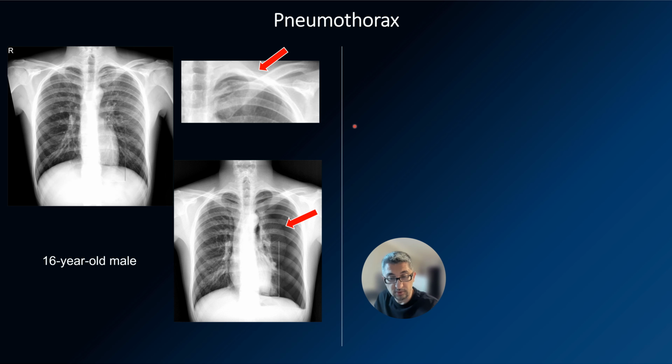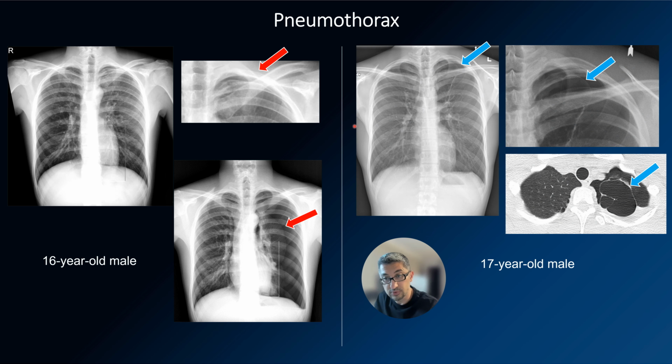So when there is pneumothorax, we should also pay attention to the underlying cause. For example, in this patient on the X-ray, we see a tiny pneumothorax, but there are also these well-circumscribed bulla at the apex of the lung, and this is confirmed with a CT study. So most likely these bulla are the cause of pneumothorax, and they rupture and cause spontaneous pneumothorax.